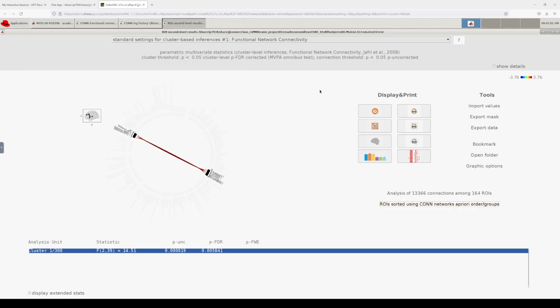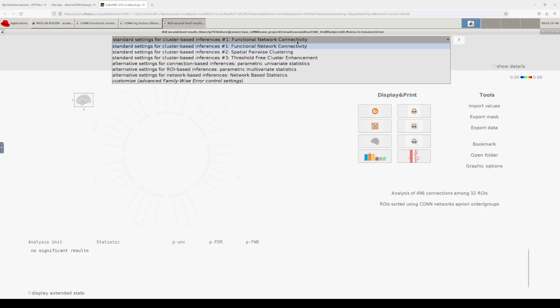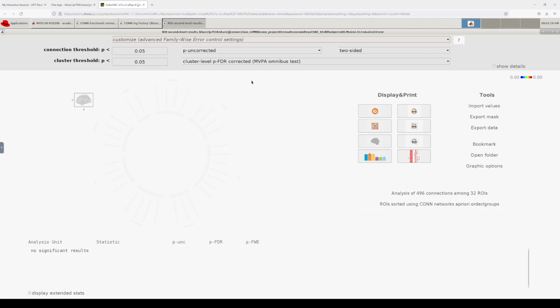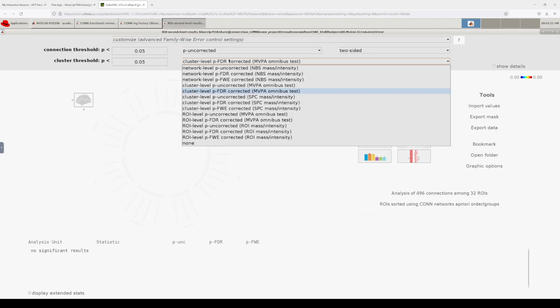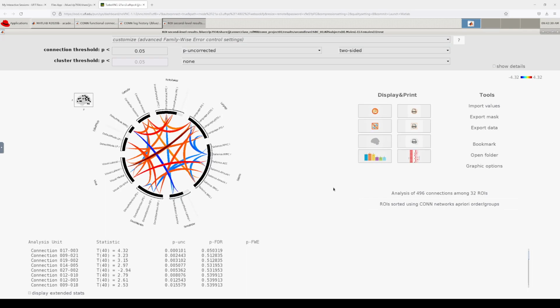Let's limit this just to these network regions of interest. So this will only be these 32 regions of interest. We're not seeing any differences in a relatively small sample. I think we have 42 overall, but we have maybe 16 to 18 male participants. But in general, we're really not seeing any differences. If I do a very, very weak, not robust statistical analysis, we can see generally here we're seeing more red than blue.